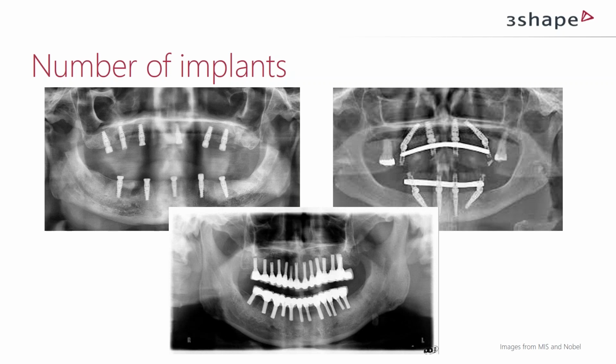Are they coming too close together? When we look at the lower picture, we can see that actually these two areas look quite tight. The other ones look okay, so that could work anyway. And this is actually a case that has been followed up several years, so it works nicely. This is a very good surgeon. But again, it's interesting that there's such variety in how it's practiced.